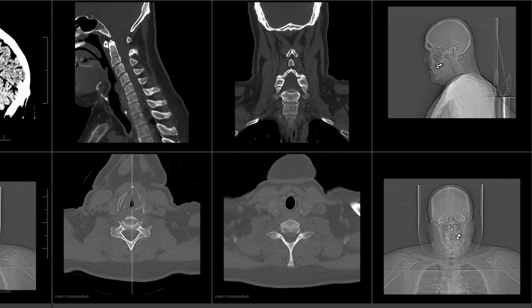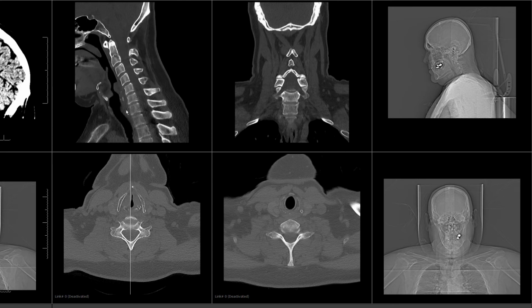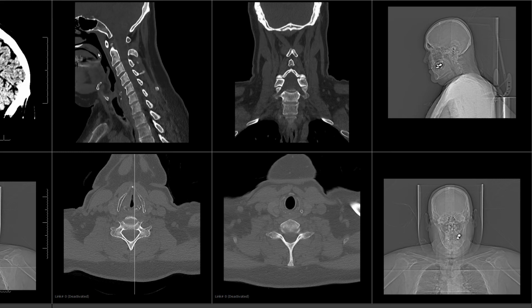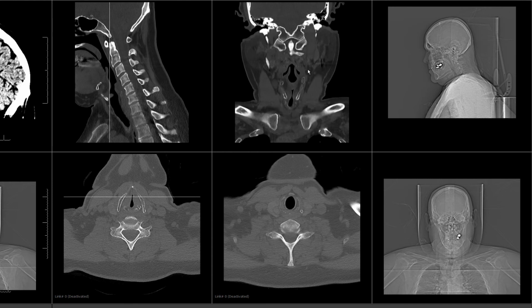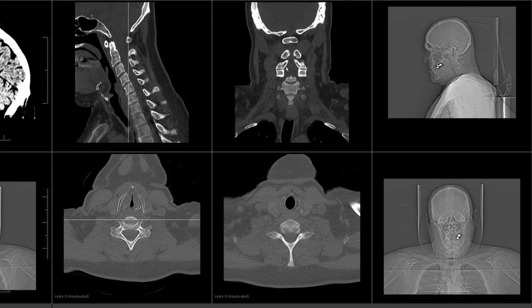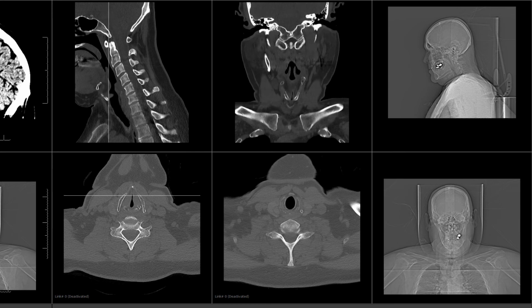as I scroll back and forth, making sure there are no fractures and no evidence of compression of the vertebral body. I'll also look at the cranial cervical alignment, make sure that the clivus and the dens have a normal relationship with each other. And then I'll look at the same anatomy, the same alignment, and then look at all the facet joints and the vertebral bodies and the cranial cervical relationship in the coronal plane.